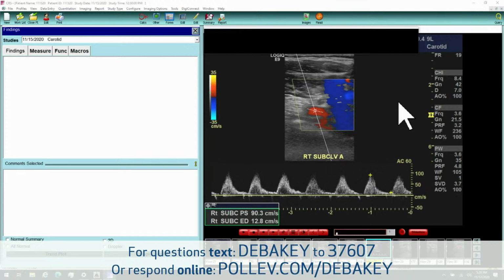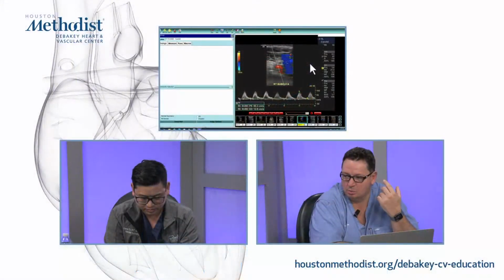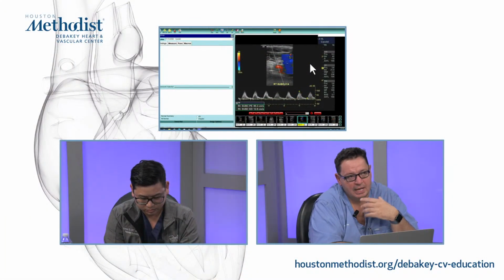in our SVU discussion channels and on the net about what is the ECA velocity criteria, what is our subclavian criteria. We actually contacted the IAC, our accreditation panel, and questioned, can you give us some guideline? What is the subclavian stenosis guideline? And they provided us that the 200 centimeter per second peak systole is the more than 50%. But here, when you do not have that high velocity, but based on a waveform, you have to call the stenosis.